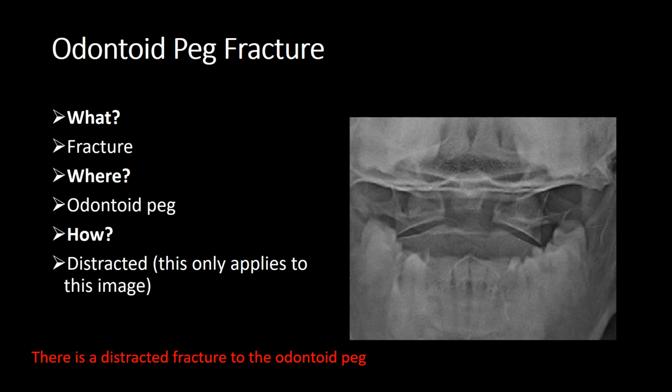So now we need to look for alignment. As we say, can't really visualize it, but actually the alignment looks pretty good. So B is for bones. Let's go around the lateral mass. That's fine. Lateral mass, fine. That's a transverse process, there's no problem.